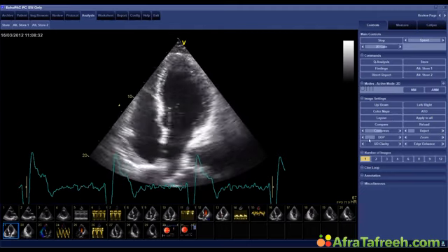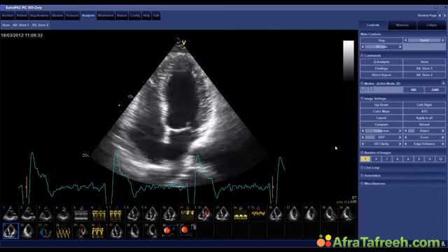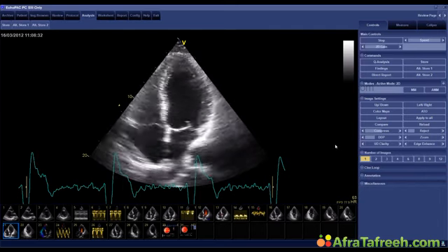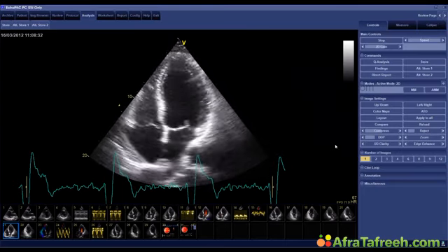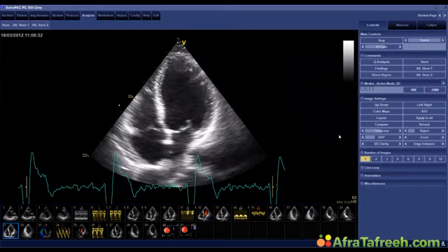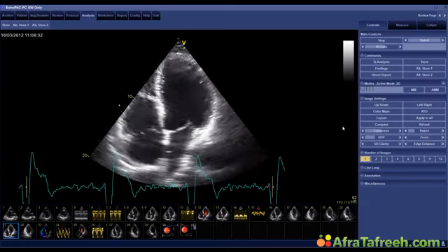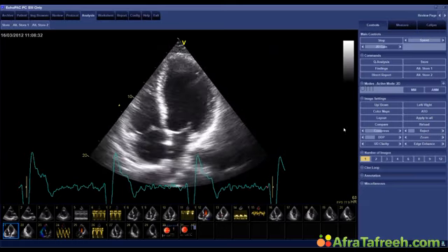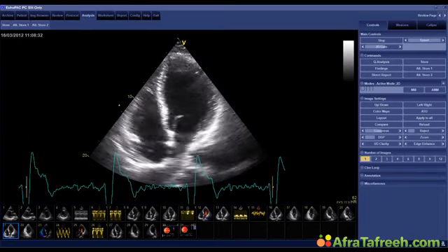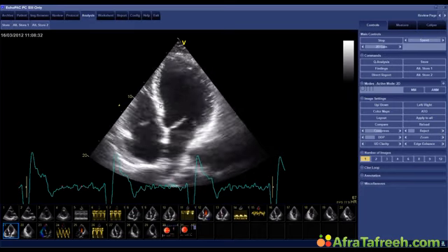Okay, so what we have here now is we have 20% think left ventricular function is normal, 20% think it's borderline, 40% think it's mildly reduced, 20% think it's moderately reduced. Okay, so most of you actually think, okay, something is wrong, or at least 60% of you think that left ventricular function is reduced. Now, this would actually mean that most of you think that he should quit flying.